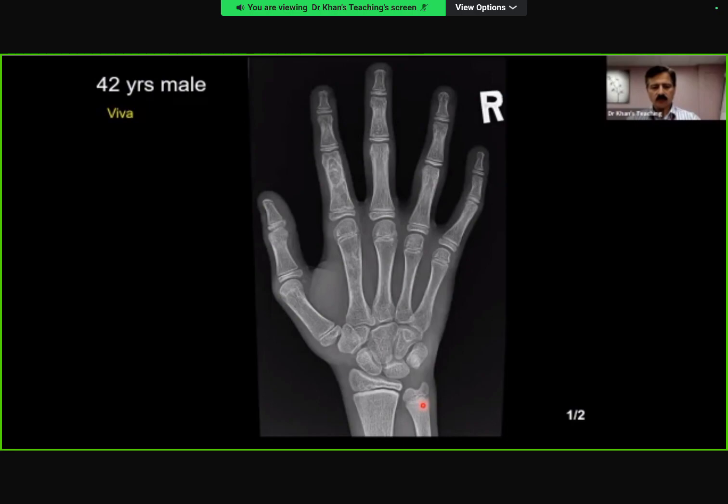Yeah, I think so. There is an abnormality of the right index finger proximal phalanx, which contains within the distal aspect of the diaphysis a well-defined lucent lesion with a thin sclerotic edge that contains some internal matrix with calcification. There's no soft tissue component, no cortical destruction, no significant deformity. It's not particularly expansile. The appearance of this lesion is most in keeping with an enchondroma. It has benign appearances. And what is your differential?